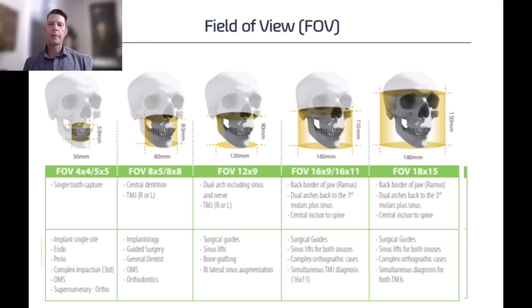Dr. Bukhari, I know you have a passion for OSA, airway, TMD, TMJ. Let's start with a larger FOV, and in this case, we have an 18x15. What are some of the clinical indications that we may use this for?